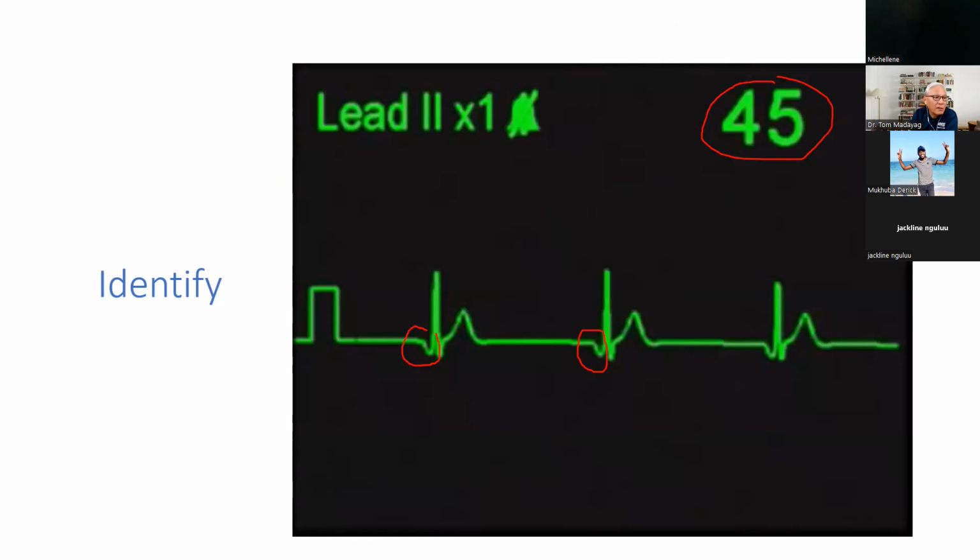In here, this is a manifestation that we have an inverted P wave before the QRS complex. Okay, so those are the 3 characteristics of junctional beats. And in this particular example, we have an inverted P wave before the QRS complex.